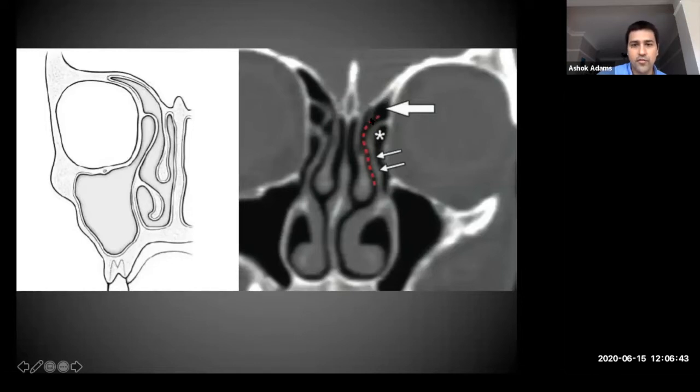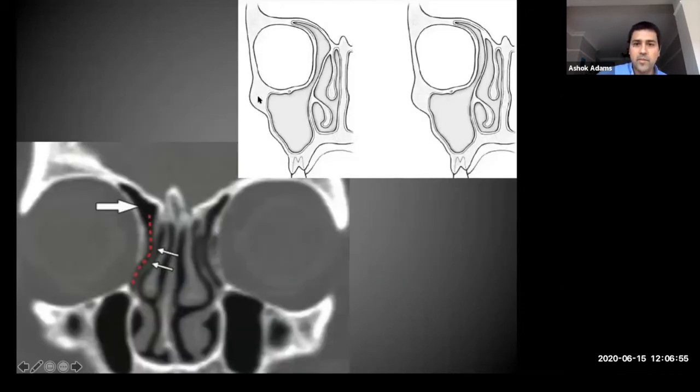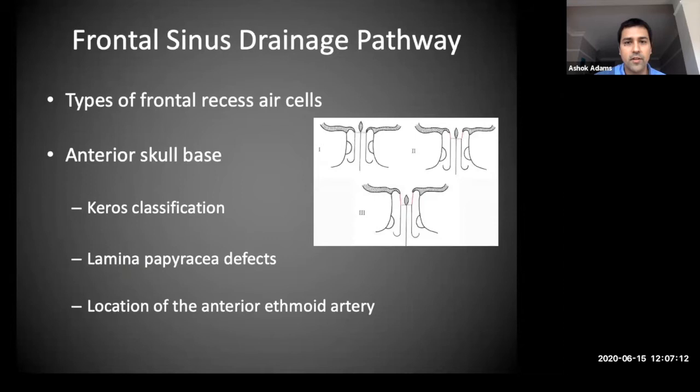So this frontal sinus drainage pathway goes directly into that middle meatus, and the maxillary sinus and anterior ethmoidal air cells will drain separately. So this allows you to explain some of the patterns of sinus opacification. Similarly, different patient. So here you can see that the uncinate process is attached onto the anterior skull base. So you know that the frontal sinus drainage pathway has the same drainage pathway as that ostiomeatal unit. So it can explain some of the various patterns of sinonasal opacification.